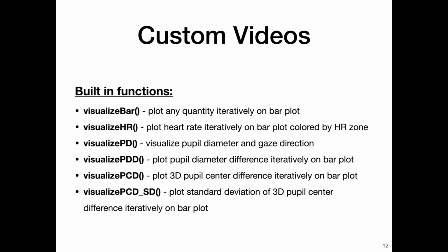The previous visualization may not always be the right fit for a specific analysis. That is where the creation of custom visualizations becomes helpful. Here we have built-in functions that create modular visualizations which can be integrated to create new user-defined visuals, such as visualize bar, which plots any quantity iteratively on a bar plot, or the visualize PD function, which creates the pupil diameter and gaze direction visualization seen in the previous dashboard.